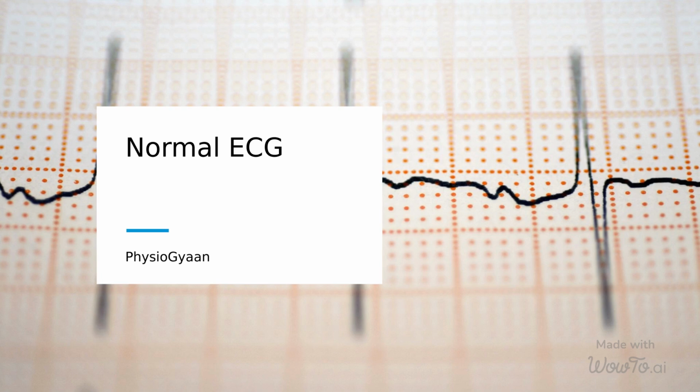Today, we will explore the key components of an electrocardiogram (ECG) waveform. Understanding these components is crucial for interpreting the electrical activity of the heart.